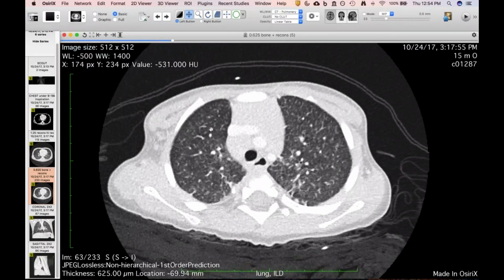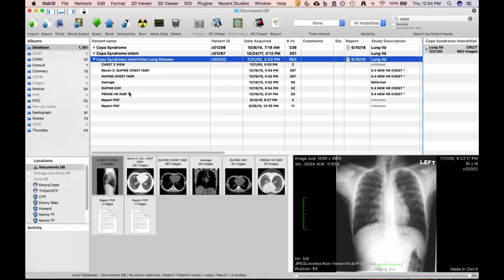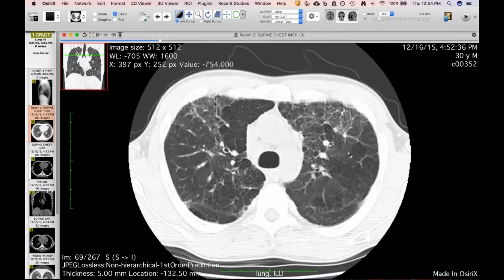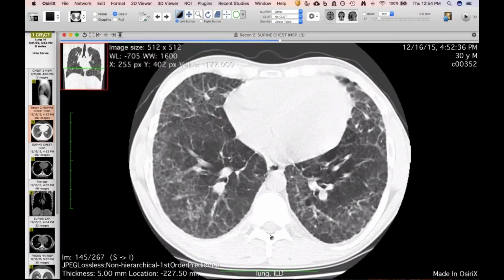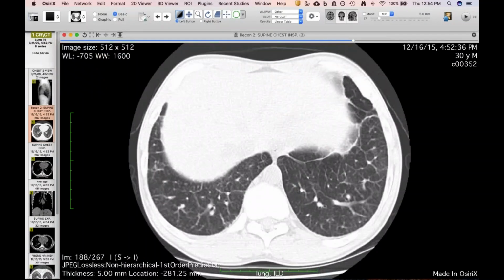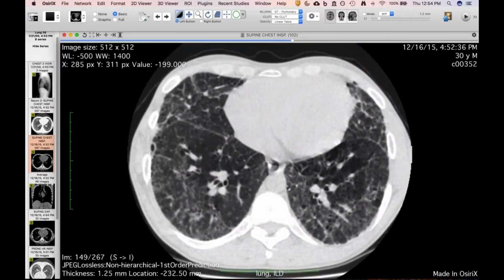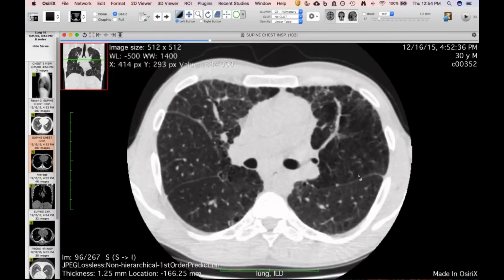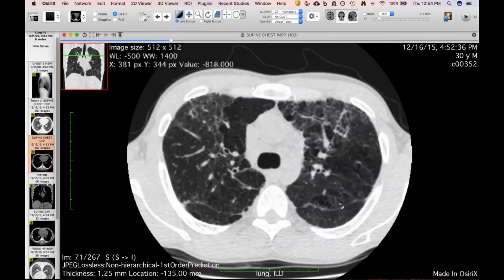Yeah. And now this is a 15-month-old, so has this confirmed genetic mutation. And it's related to one of these patients. I don't remember which one it is. This is a patient who has more, it looks like some areas of emphysema, some cysts. This is an older patient, maybe you could even argue a little bit of honeycombing. This was from a few years ago. But this is a patient who was originally diagnosed with juvenile rheumatoid arthritis and then later was revised to COPA syndrome once they had the mutation test available.